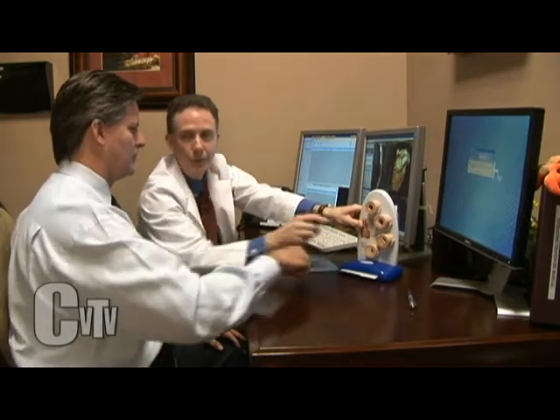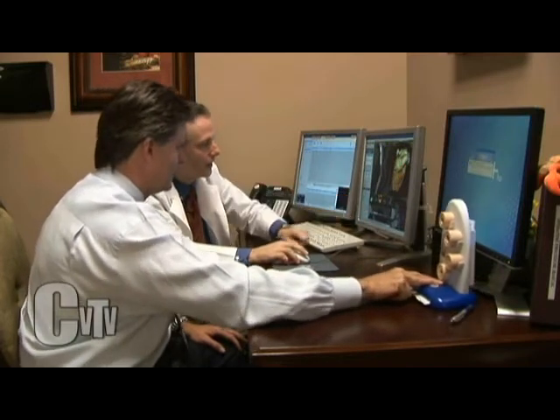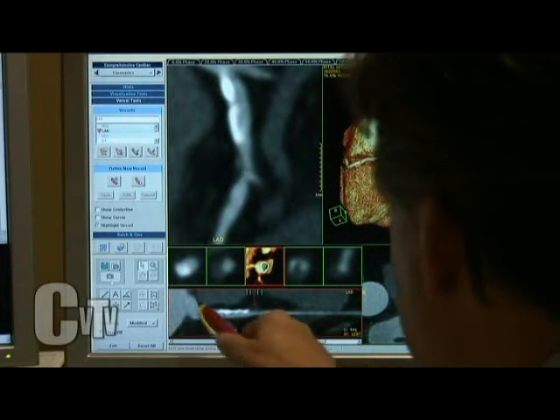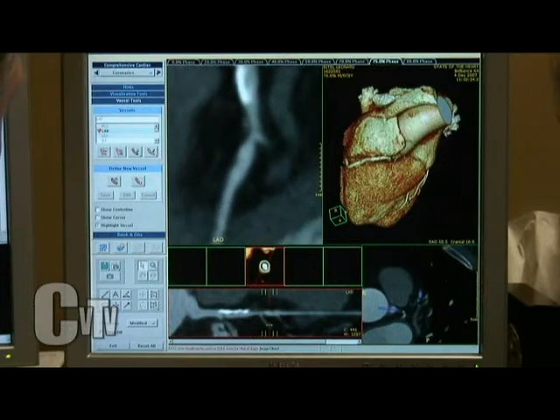And down here is when we flunk our stress test. Yeah. And have chest pain. Got it. And here you can see the channel, and then this is all the plaque out here. Okay, so let's just focus on the circle, and then take us on the virtual donut tour here. And then here, as we get into normal vessel, you can see that the wall is nice and thin, and there's the channel or the lumen.